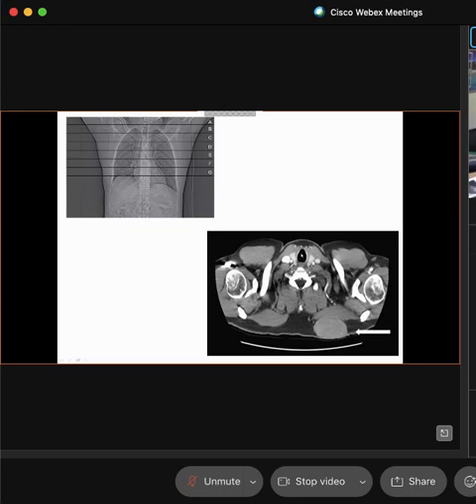What does this color right here indicate, John? Air. Perfect. Now, where could air lie anterior to our vertebrae? Trachea or esophagus, right? Depending, it's going to be either or. So this is going to be the esophagus, and this will be the trachea. So if you go back and you look at this, where does this mostly fit? It would be A, because I don't see lung.